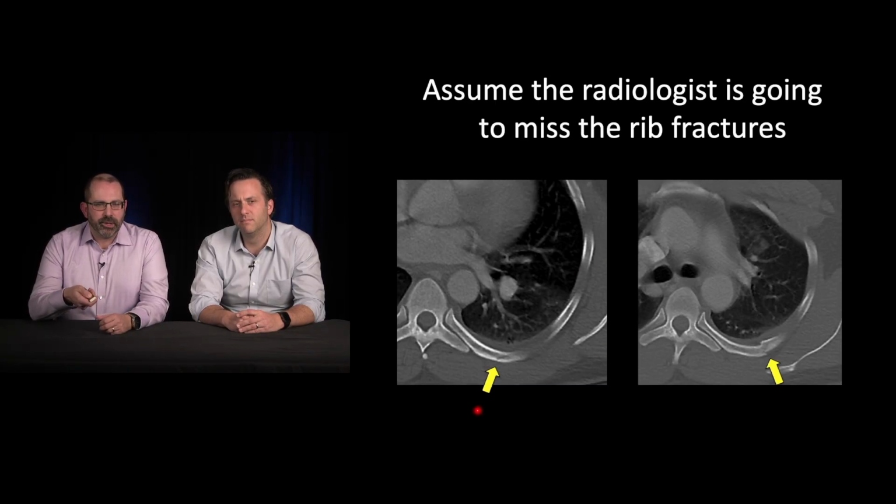Absolutely. Here's a fairly non-displaced one. These can be really subtle. Here's a little bit more displaced one.